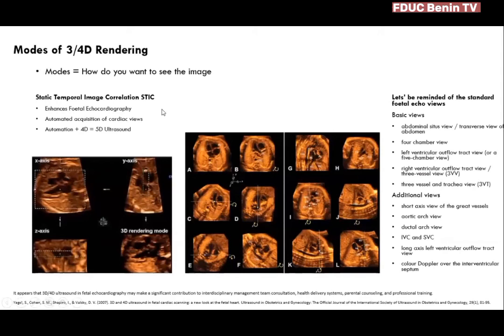Finally, in this presentation, I'll refer to the static temporal image correlation mode, the STIC mode. Now, fetal echocardiography is a growing discipline. It's been perceived as highly specialized. Operators are considered well skilled, and sometimes they say that it's difficult to acquire all the standard images that are required for complete assessment of the fetal heart.